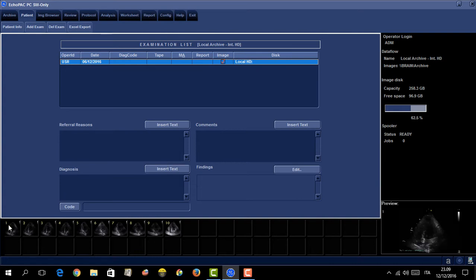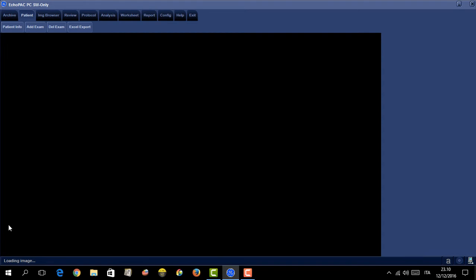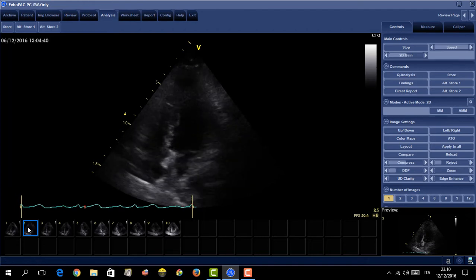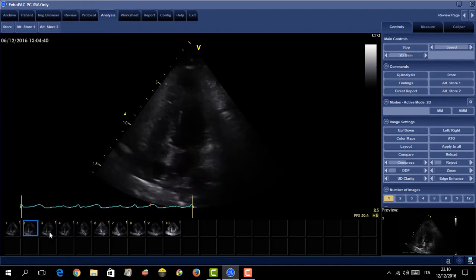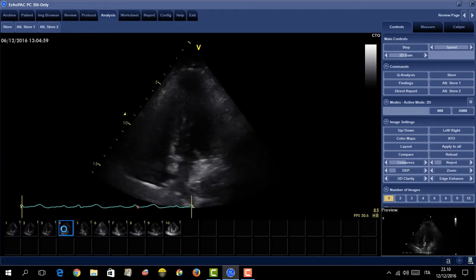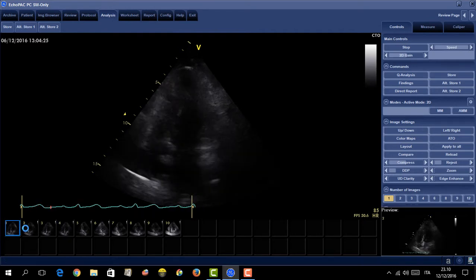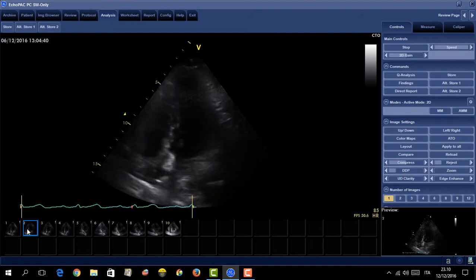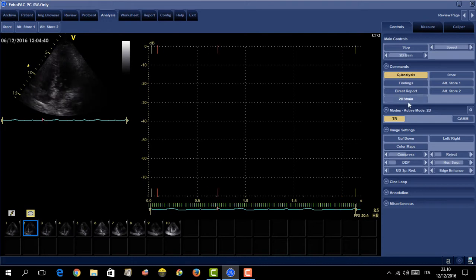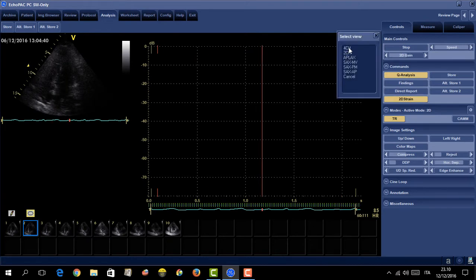Proceed by selecting an apical 4-chamber view. Just remember, when choosing the proper apical 4-chamber, that you want to see the endocardial border as clearly as possible in order to have no troubles with the tracking analysis. In this specific case, I would probably go with number 2 here. So hit Q analysis and 2D strain to proceed, and select the proper view, in this case 4 chambers.